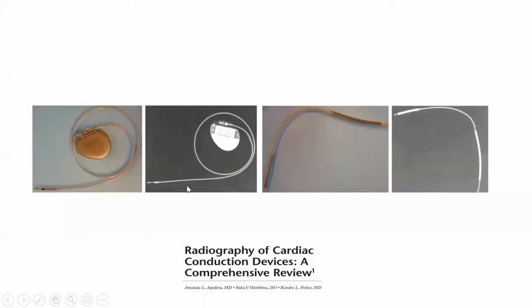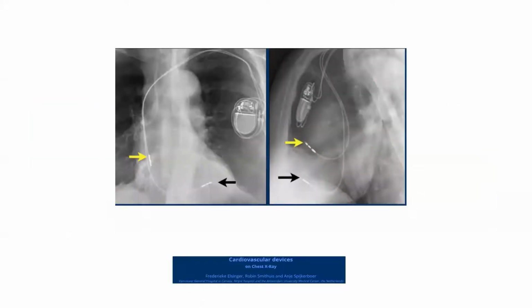Small density here. But when you look at the ICD, there are proximal and distal large coils like this, and they are seen clearly in the X-ray. So you can tell that this is an ICD lead, not a pacemaker lead, by seeing the coils, the proximal and distal coil. Okay? Are you following me? Okay. So are you ready for the exercise now? Now, what do you think?